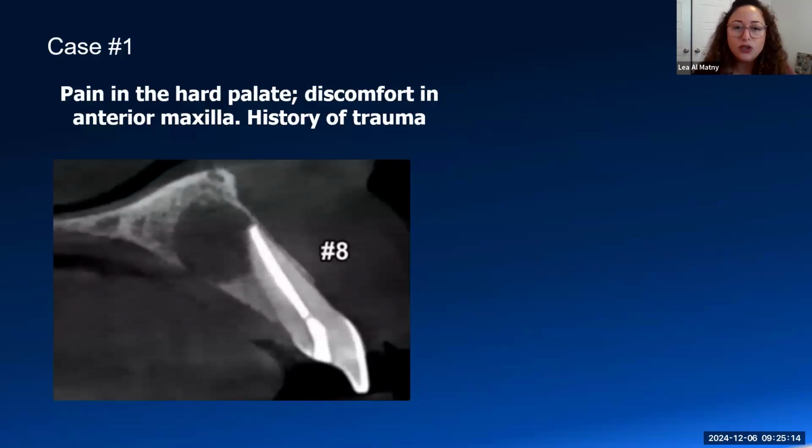And the question was, I did this root canal treatment, and this lesion of endodontic origin is not shrinking. It is not improving. In fact, I see it become larger. And if we look at this CBCT scan, it might be easy, as a quick look, to assume this is a lesion of endodontic origin.